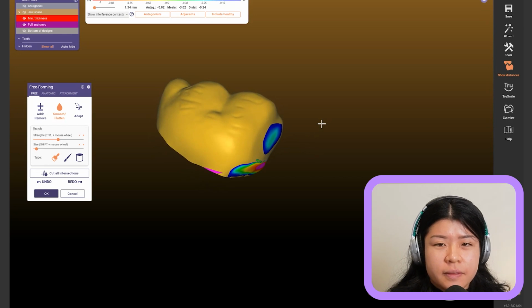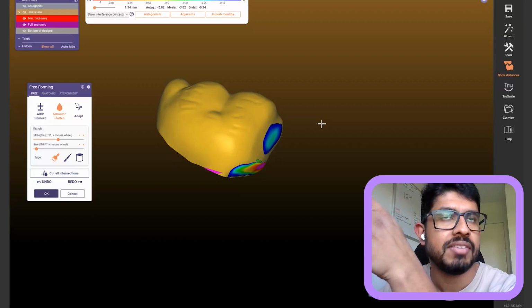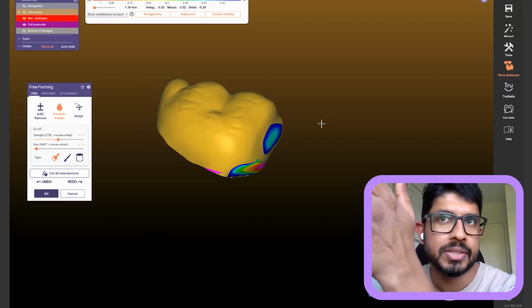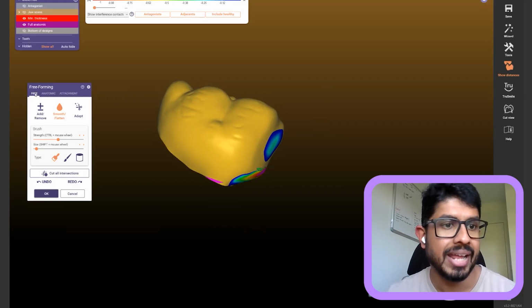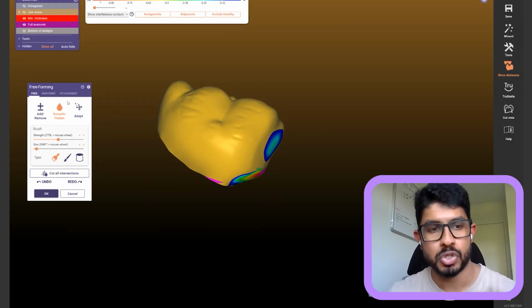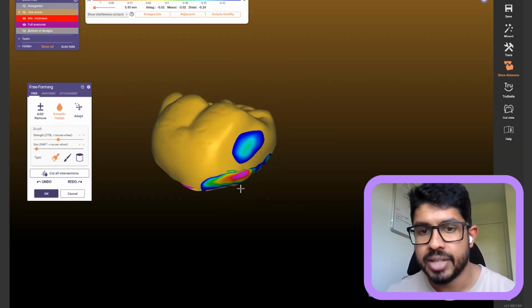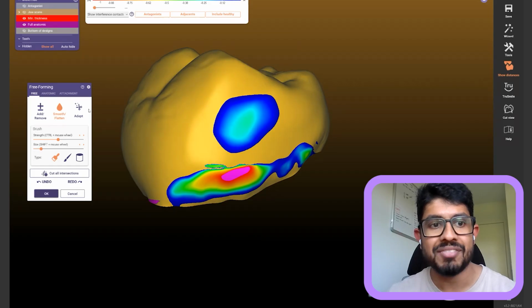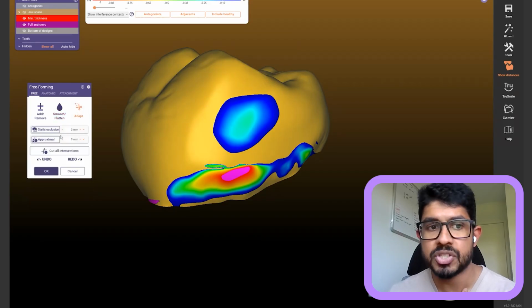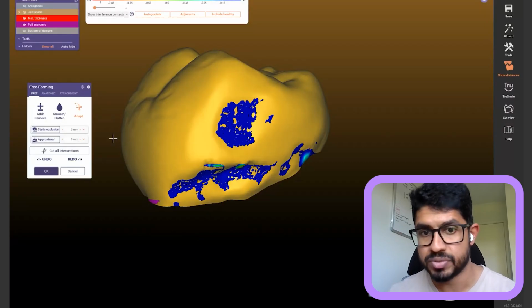And it's easier. I mean, you should ideally, if you have your settings right, you shouldn't be adjusting your crowns in the mouth, but you would rather have something slightly higher than slightly under, because then you have to send that back for them to add porcelain, or you have to remill something. So it's just easier to go ahead and have that. So in normal cases, people usually have negatives, or usually a bang on zero. And if you have a good quality mill, that usually gets it exactly right. In terms of contacts as well, you have the option of clicking on adapt. If you have this on zero, you can just click a proximal, and that just dials that right in, and it just simply removes that contact.